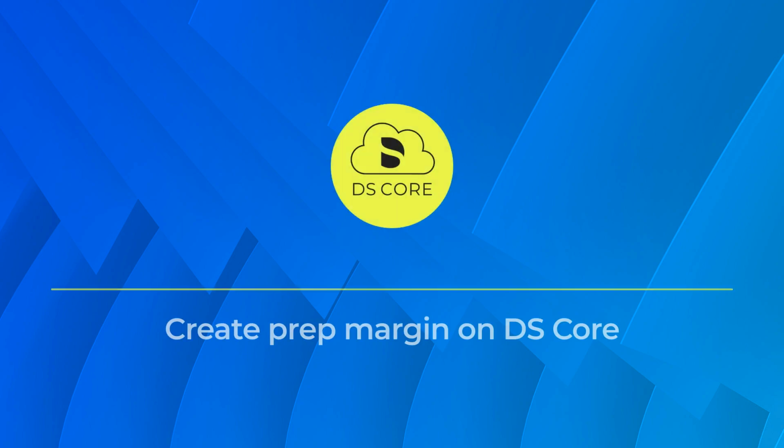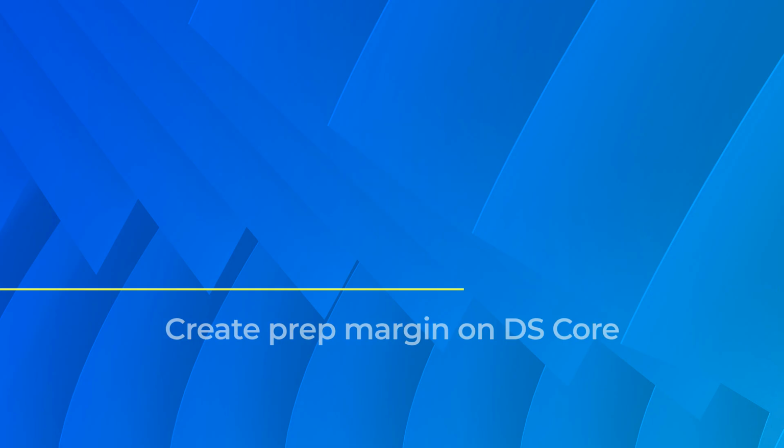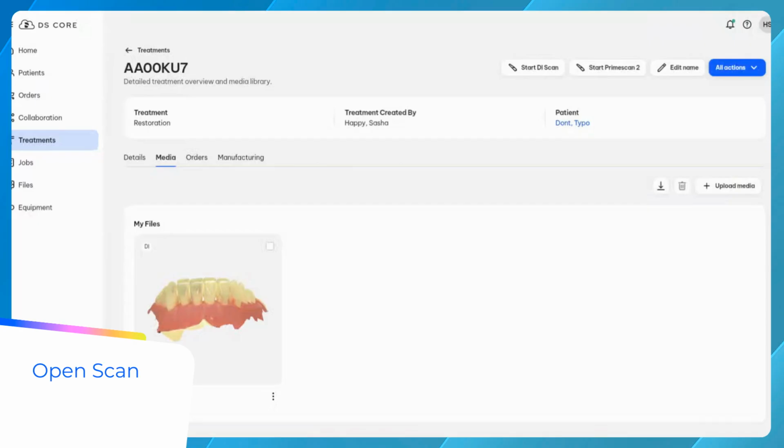The following tutorial explains how to adjust the model axis and create margins on PrimeScan 2, PrimeScan, OmniCam, and Trio scans. Let's begin. To create a margin, start by opening an eligible scan within a treatment. Remember, this feature isn't available in the 3D viewer of our media gallery.